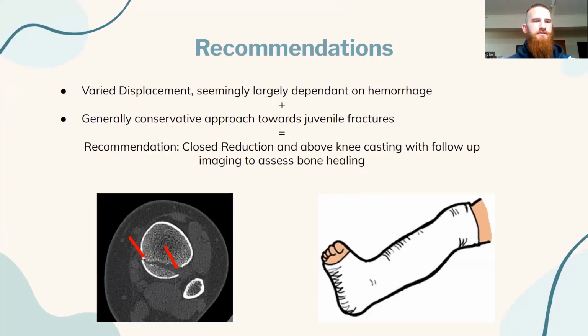When looking at our patient's fracture, there is some displacement. However, it appears varied, with it being near non-existent in places, with some areas in the same slice also appearing greater than 2 millimeters apart, where blood is exiting the fracture site. It is also possible once the bone vasculature clots off and the blood is drained away, the pressure within the bone would decrease, thereby reducing displacement and allowing for closed reduction of the fracture site.